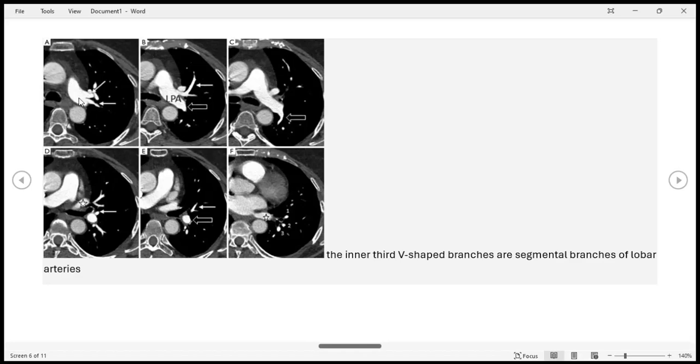So it's not the first order pulmonary artery branch. Okay, so either the right or the left main pulmonary artery are not a branch. However, they give the lobar branches. The lobar branches. Okay, these lobar branches are the first order pulmonary artery branches. First order.